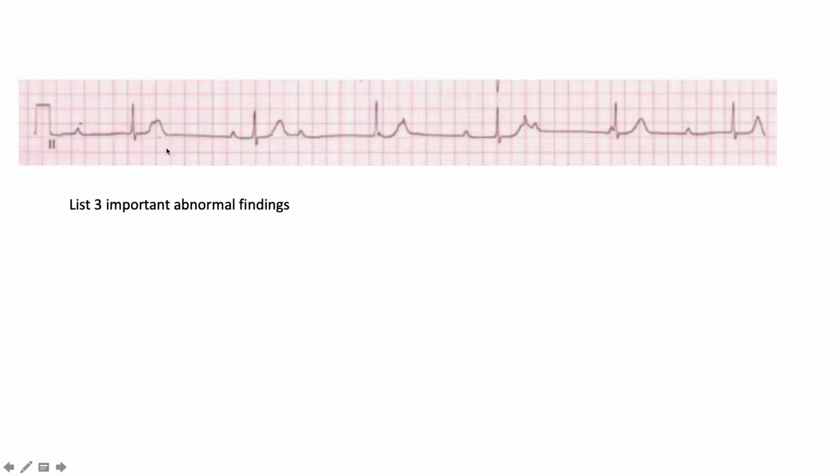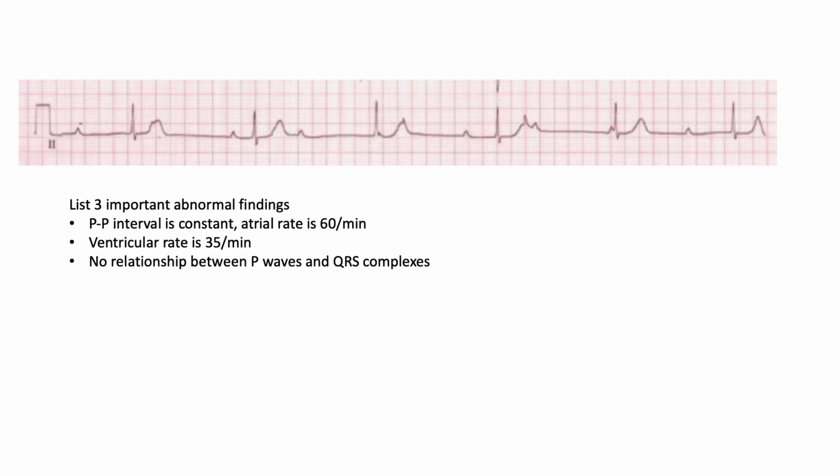What's happening here? Okay, if we look here, guys, we can see that the P and the QRS waves are just not talking to each other. They got bad blood between them.